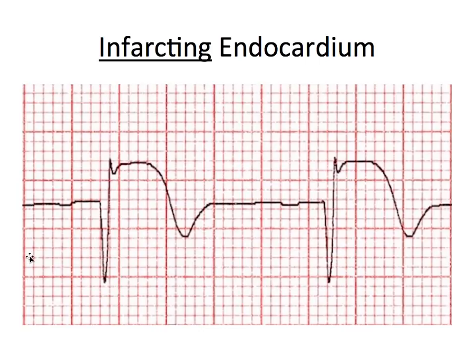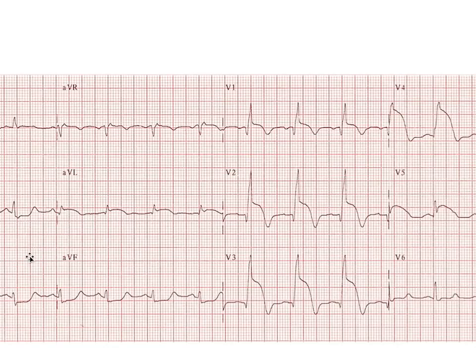So let's go on to the next EKG. This is what you're going to see at 2 in the morning when your patient comes in with chest pain. They just couldn't get to sleep. They were kind of sweaty and they felt sick. So you get this EKG, whether your nurse or paramedic hands it to you or you take it yourself, and you're looking at it and you're like, okay, what's going on?